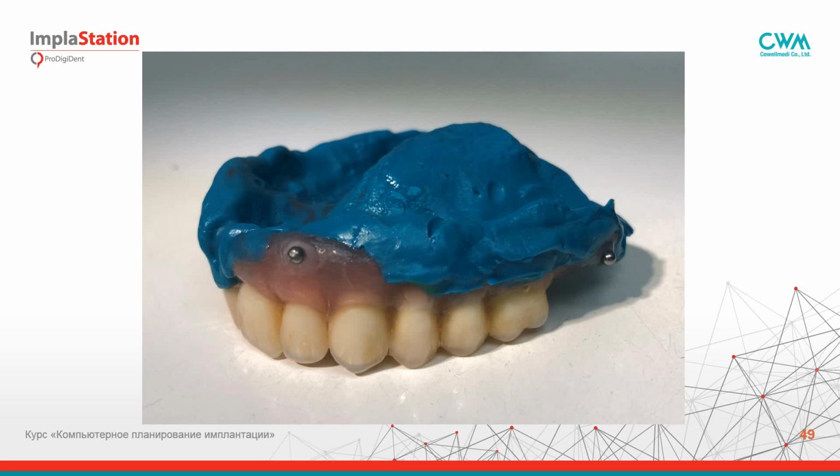Then you see some metal balls as X-ray contrast markers attached to this denture. So there is a double scanning technique, when the first scan is made with the patient together with this appliance in the mouth, and the second one is just the appliance without the patient with a low dose.